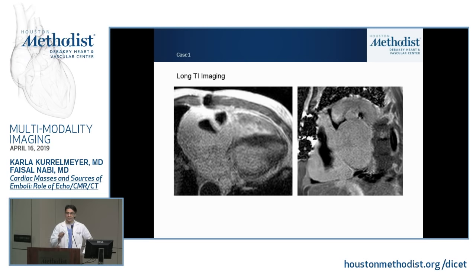Everything else, you'll notice, will have a whitish look in the images, including the myocardium, because it has contrast. So this sequence is done in such a way where only things that are completely devoid of contrast uptake will appear jet black, the definition of a thrombus. And you can see these things are completely jet black. So with confidence, you can say that this is thrombus.